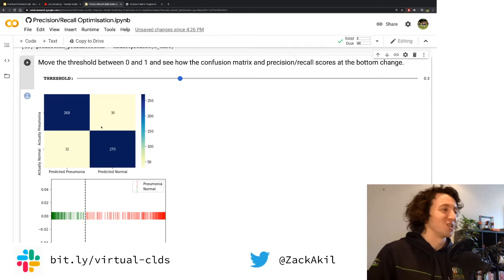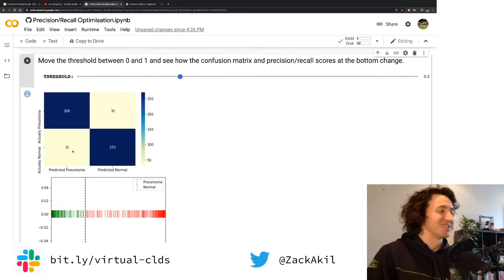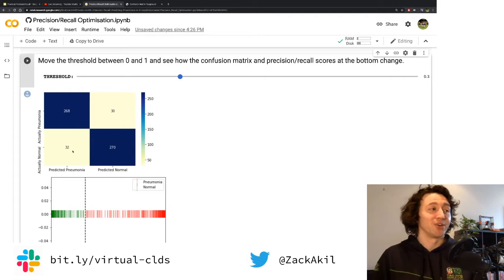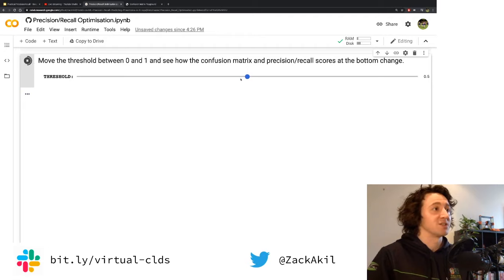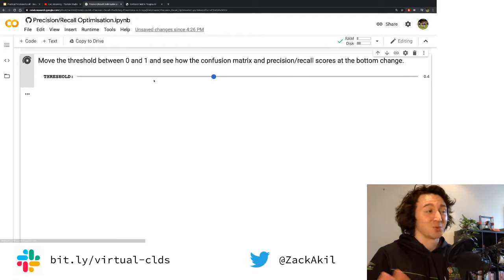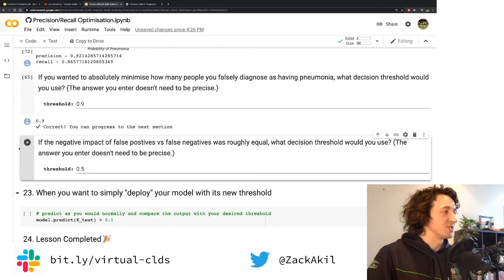But if you train a model long enough, a decision threshold of 0.5 should give you a balanced trade-off between false positives and false negatives. In this instance, it completely depends on your data and the model you're training with how you get a balance between this. And you would use this exact tool, like a confusion matrix, as a way to monitor the effects of the threshold. So for the way I train my model, a 0.3 would give a balanced one.